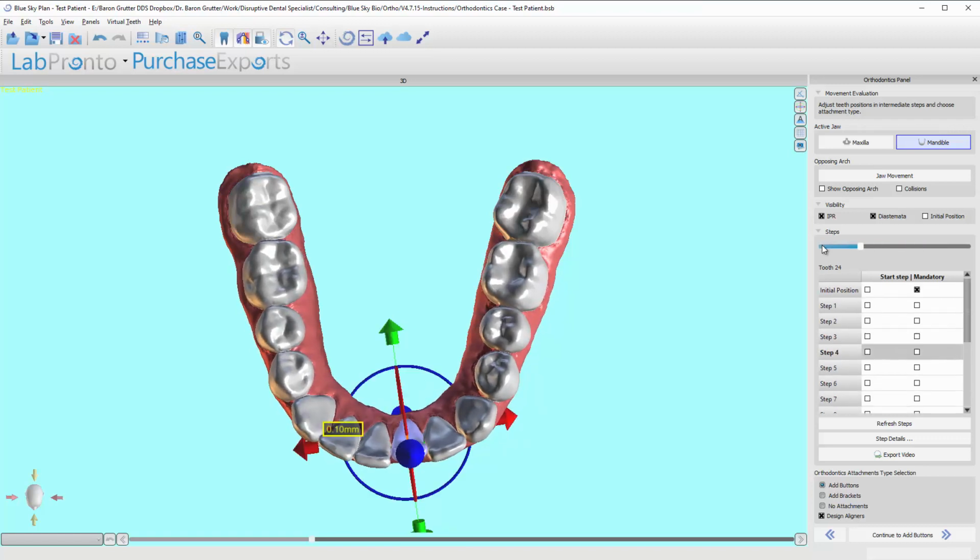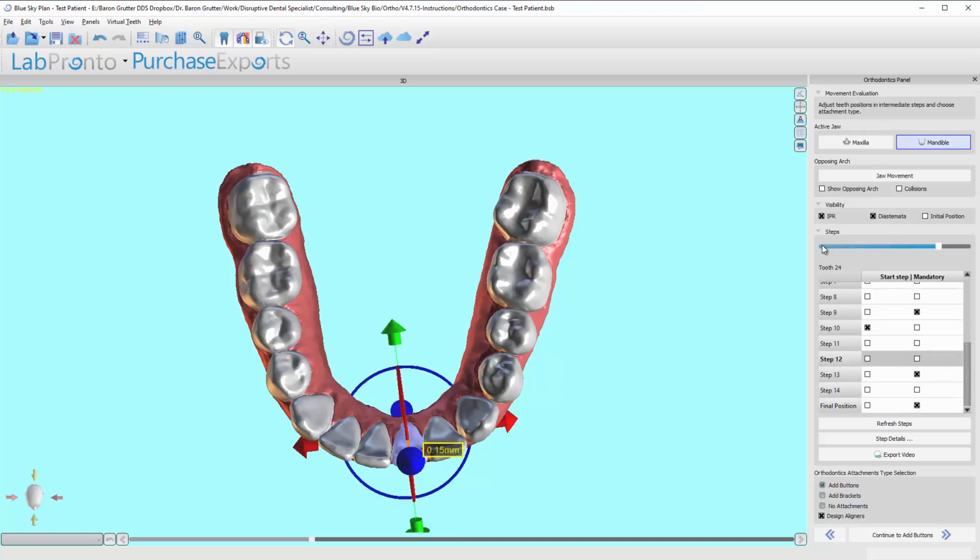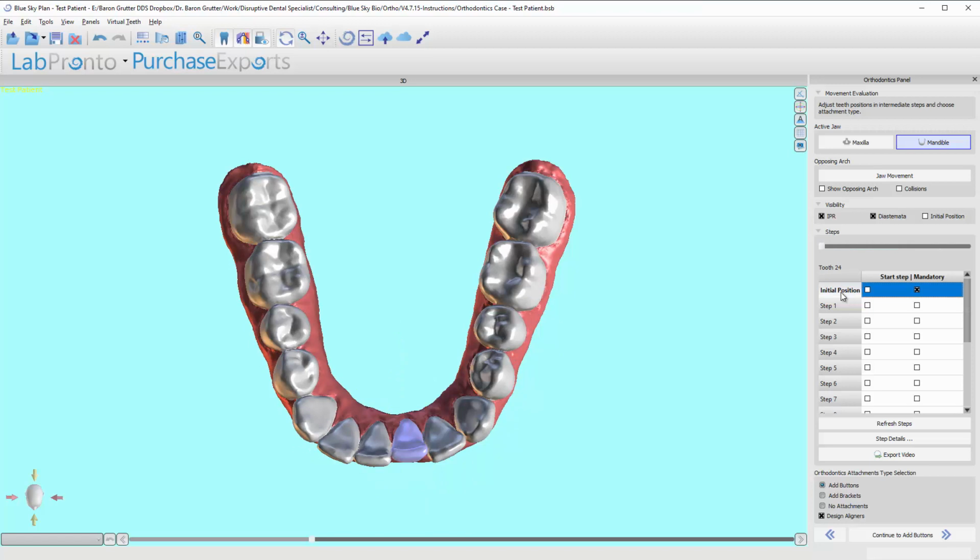Okay. If you see collisions where there's, for instance, this one right here, there's 0.15, but I also know there's a little space over here. I'm going to ignore that. I know the tooth will squish over to the midline a little bit and make its way through. I'm not going to reroute direction, which we can do, but not for something like this. 0.1, 0.15 maybe, and if I see space next to it, I'm just not going to worry about it. If it's more significant than that, in a more highly crowded case, there are ways to do things to avoid that.